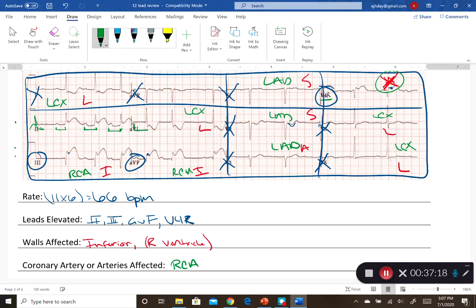Third P wave, PR interval. Then we're moving into another lead, but my PR interval is actually getting longer. So I think it's actually easiest to see up here in lead 1, even though we don't typically look at lead 1 for rhythm identification. We can see that PR interval getting longer. And it's hard to see whole rhythms on these 12 leads, but we can even see it down here.